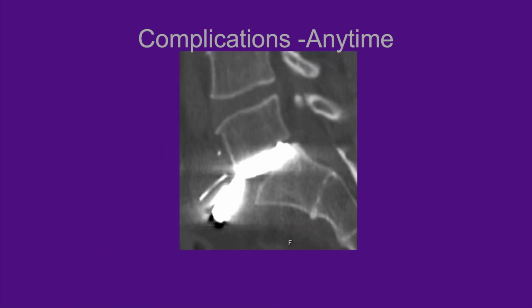And here we have a patient with a disc replacement where the modular disc components have disengaged and the central polyethylene core and an inferior end plate have been displaced into the prevertebral soft tissues.